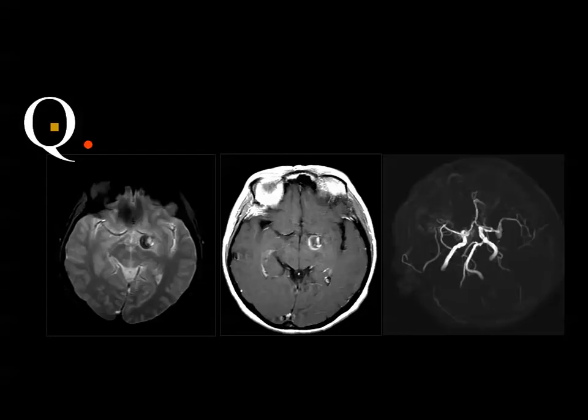And you see a part of the lesion. This is an aneurysm with a partially thrombosed lumen. This is the patent lumen, and the rest of the aneurysmal mass is not seen on angiography, denoting that there is a thrombus. And whenever you inject contrast material you get some turbulence of the contrast inside the aneurysm, and this is a helpful sign.